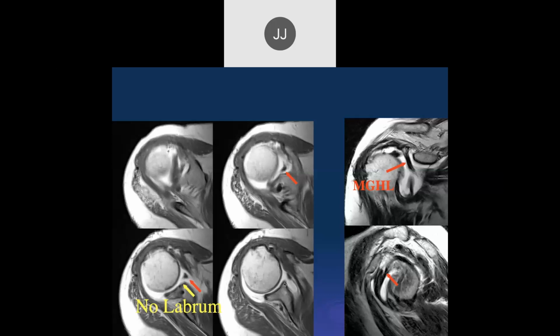Yeah, and there's great variation in these, as John has told us already. We'll see a lot of areas where there are ligaments that are named, but they're really just thickenings of the capsule. We'll see a lot of those in the wrist as well. And this complex is called a Buford complex. So just be aware that this is considered normal anatomy. It's a variant. Some people believe it's around 6.5% of people, so you should be seeing this almost every day.